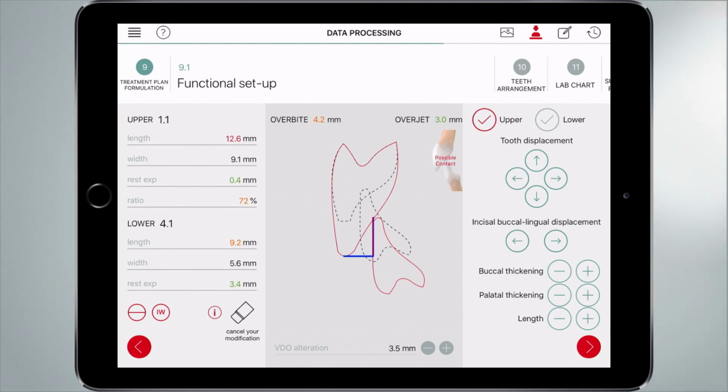That is what we want to achieve at this point. That is what we want to give to our dental technician and to our colleagues, other specialists. So we can customize, as you have seen. You can accept the value that the app gives to you that are already great, or you can modify a tiny bit and achieve the best result. Now, from step 9.1, we go ahead.